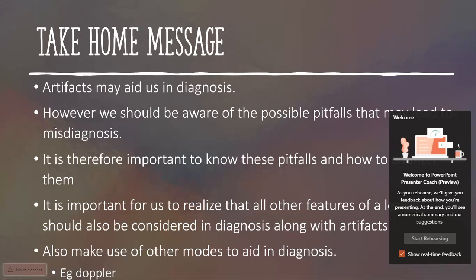Another important thing is for us to consider all the other features of a lesion in making a diagnosis, and not just to rely on an artifact. It is an aid in diagnosis, but not the main consideration. Also make use of other ultrasound modes to aid in diagnosis, for instance, adding color Doppler to a lesion.